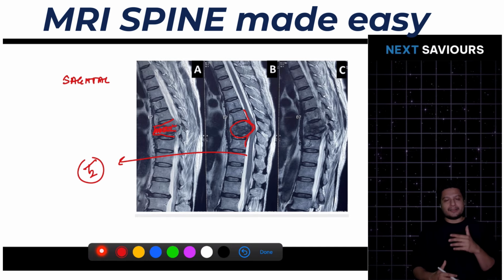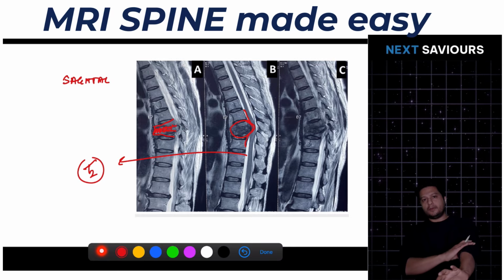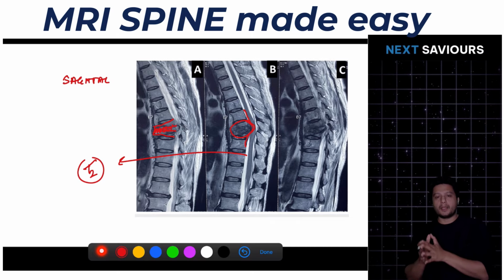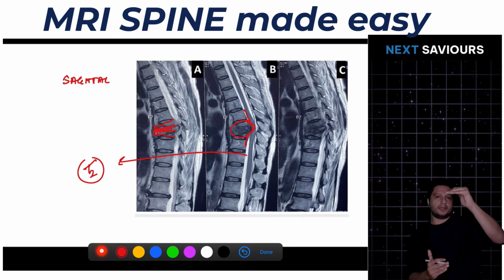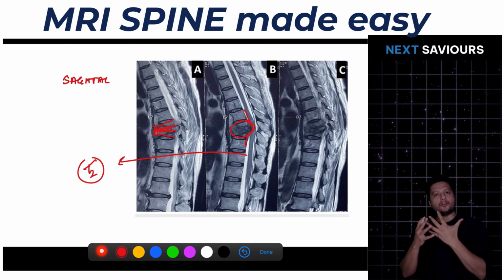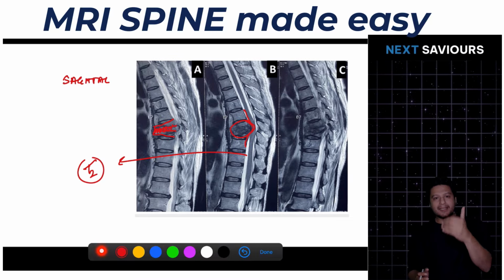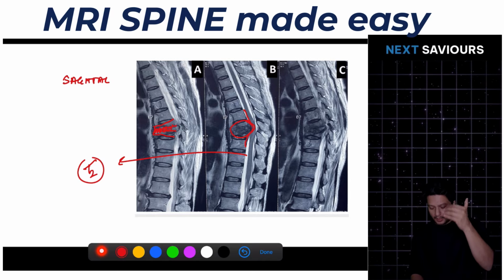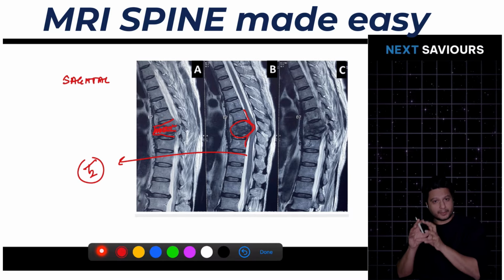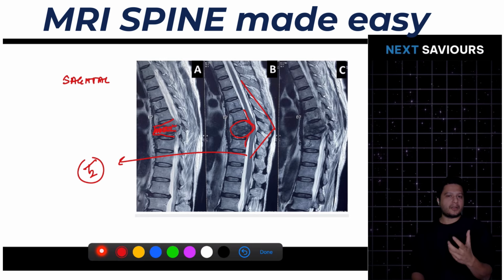So once you see this type of degenerative or disintegrative changes along with the thecal sac indentation, thereby compressing the cord, with a long clinical question giving you all the clinical features of tuberculosis of the spine, then you have got no other option than to mark the answer as Pott's spine. It is a single level spondylodiscitis, thereby causing degenerative changes in the adjacent vertebrae and the intervertebral disc, leading to angular kyphosis and compression of the cord. So the answer is very simple.